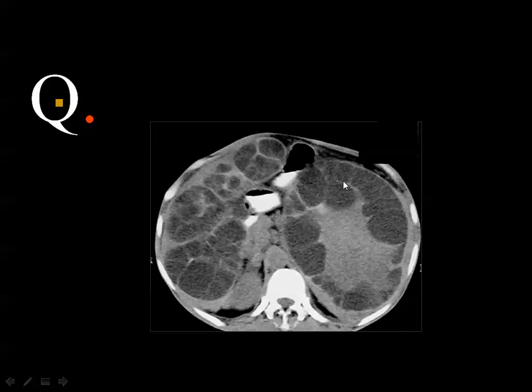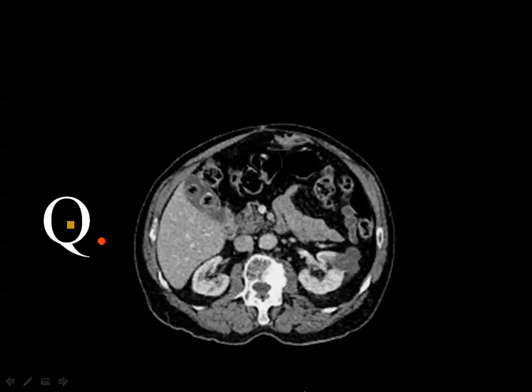The lesion in the spleen showed the characteristics of hydatid disease in the form of multiple mural cystic lesions representing the daughter cysts. If you see this lesion, which is characteristic for hydatid, and you see lesions in the liver appearing like simple hepatic cysts, you should consider all of them as hydatid cysts. Okay.